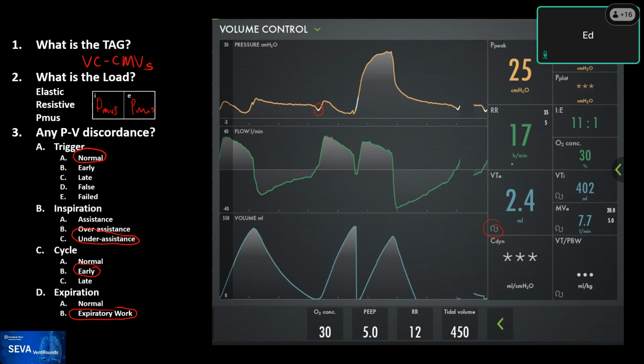I would highlight a couple of items, and this is one of those features in which you can see that the patient took a breath in and didn't exhale anything, exhaled very tiny, then the volume resets to zero because we triggered another breath. You see another breath was triggered, the machine resets, another tidal volume is delivered, okay?